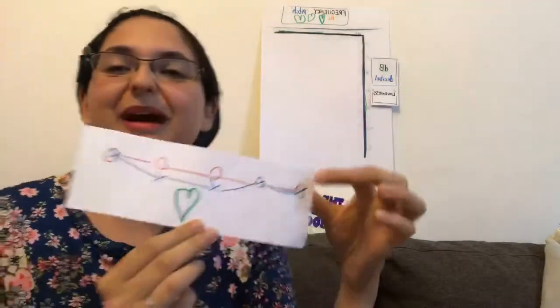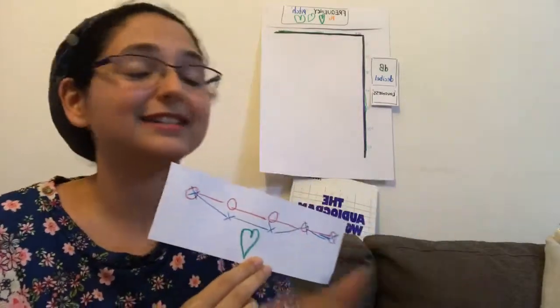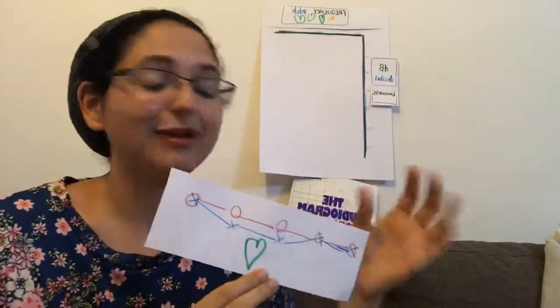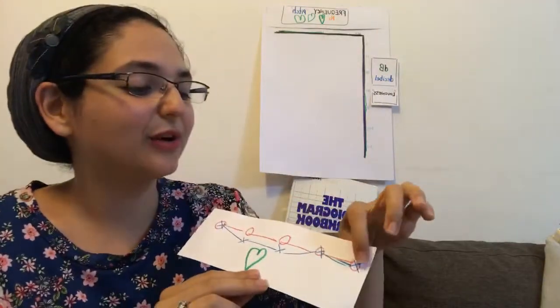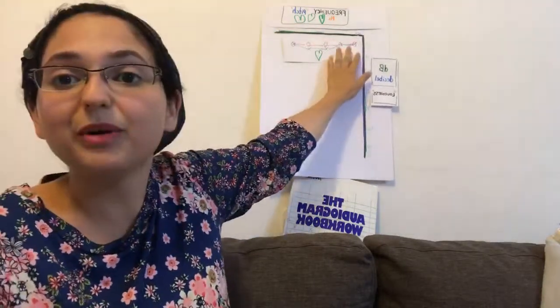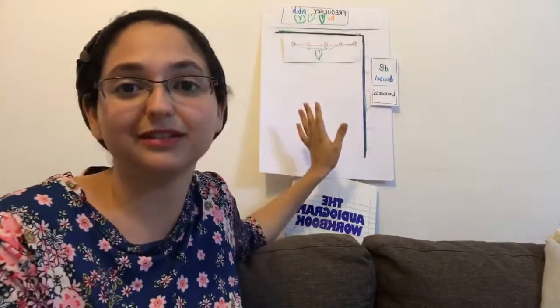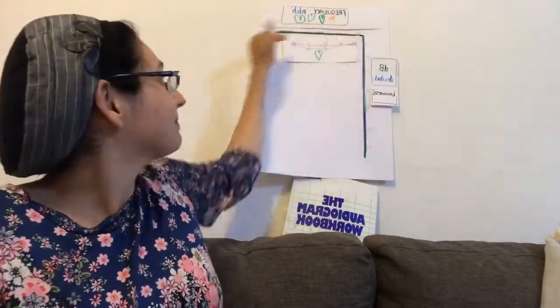So let's say you have these kind of results. Red circles are for the right ear, X's are for the left ear, red and blue, red right, blue left. And so you're going to get responses all across the different frequencies, right? So this would be a normal test result with all the circles and X's way up high at the top.